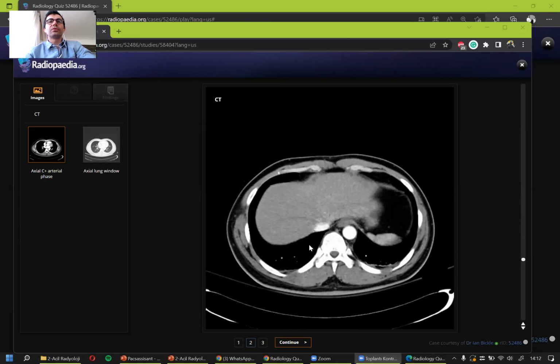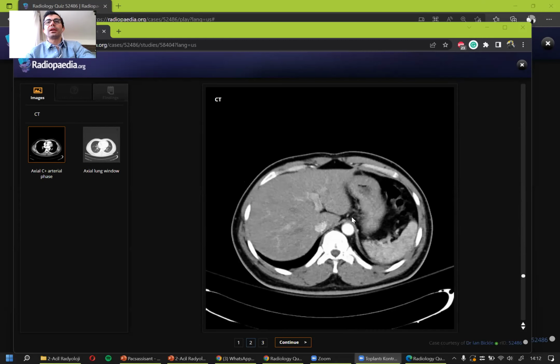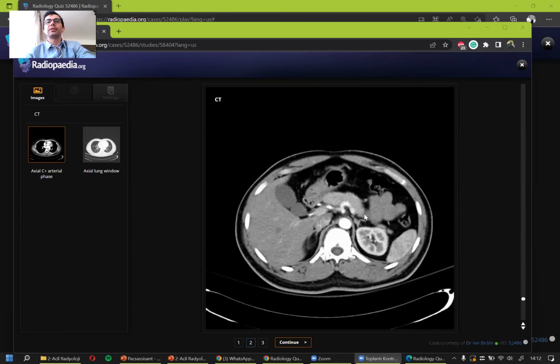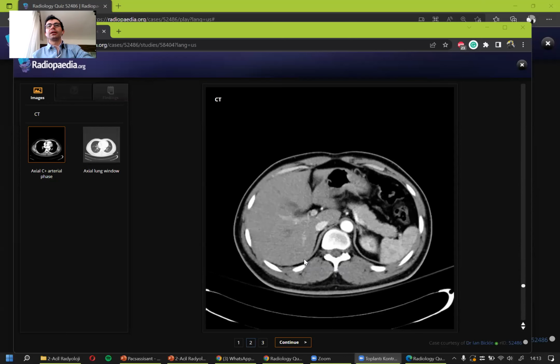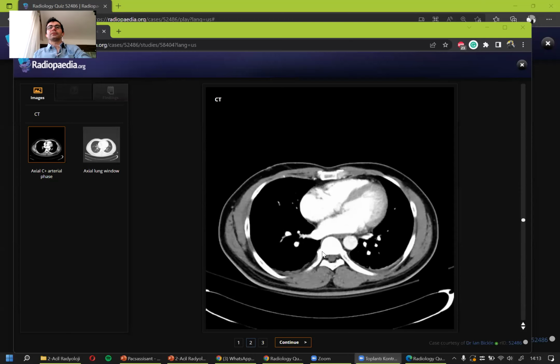And I go down more. I'm seeing the liver, the spleen, and the stomach. If I go down a little bit, I'm seeing the pancreas and afterwards the kidneys. This is usually the end of a typical thorax examination. Because I'm trying to see the whole lung, I'm including some of the abdomen as well, because it's going down on the backside, right? So why am I not seeing the lung here?